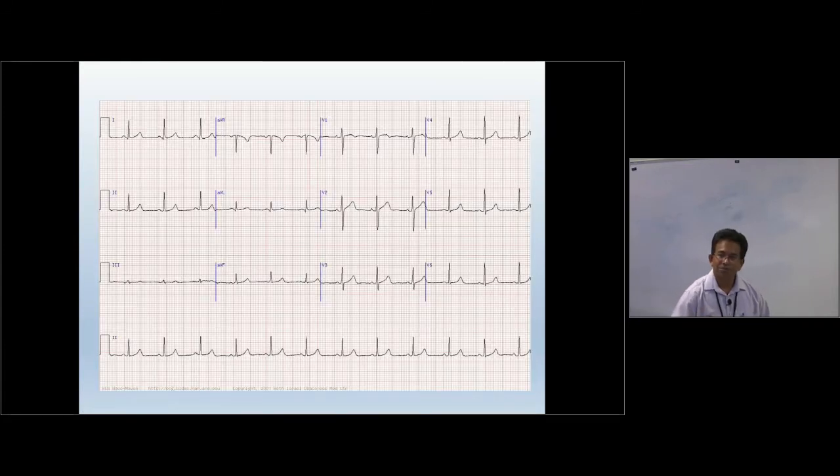All right. Now we put everything together. We can get the 12-lead ECG graph like this. Now you can see this side. You can see the standard leads 1, 2, 3. Then you get the limb leads. Then you have chest leads V1 to V6. So those are the 12 leads, and the 13th one actually, the same thing like that, lead 2. All right. Now in a minute I will explain why we select lead 2 as the rhythm strip.